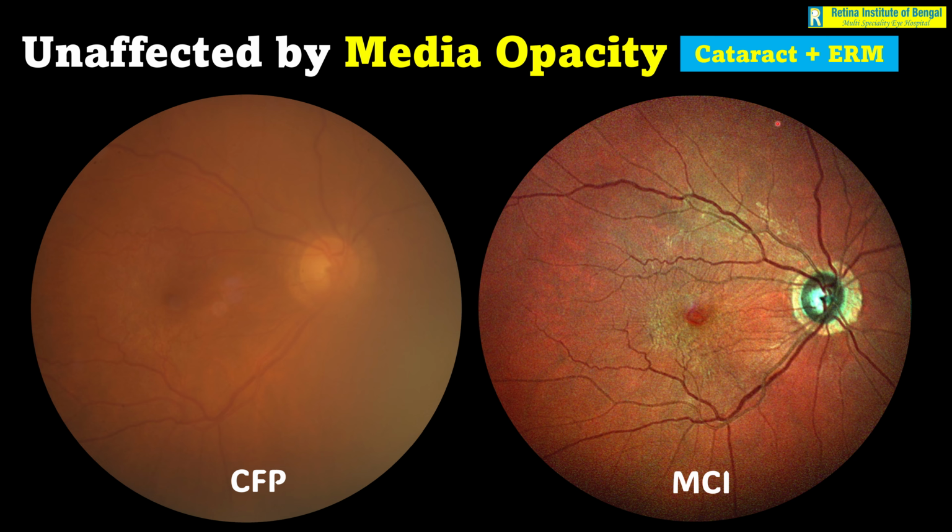In other words, if you have a multicolor imaging facility, evaluating patients in the pre-op stage, prior to a cataract surgery, evaluating the retina becomes really easy, because the multicolor image is not degraded by media opacity, as it is a scanning laser ophthalmoscope based system.